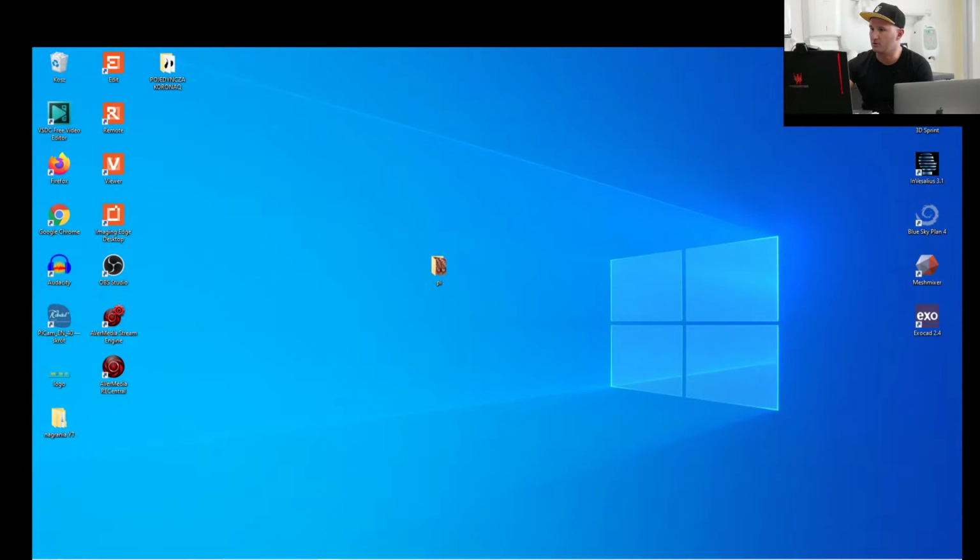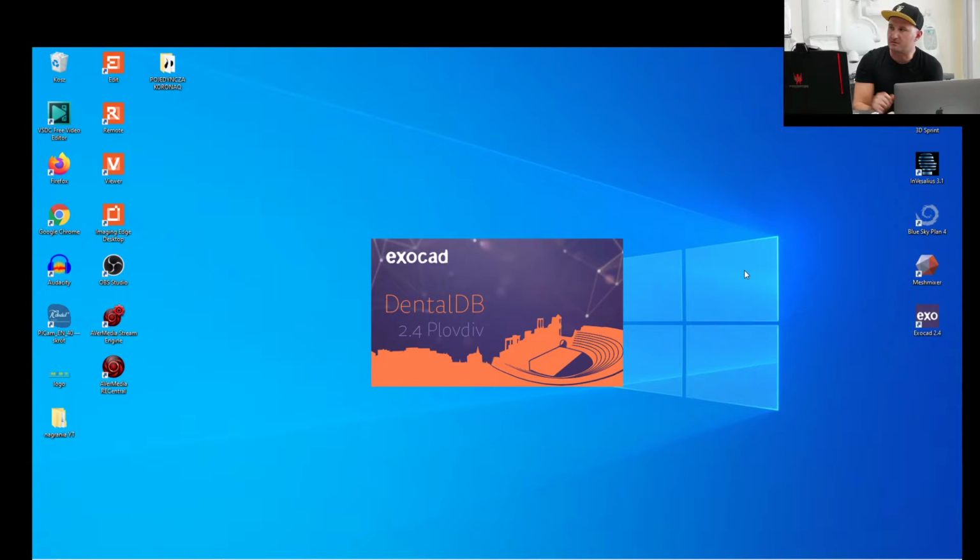Another episode today, again about digital dentistry. And today I am going to show you how to design a screw retained implant crown in Exocad after immediately placed implant with surgical guide.